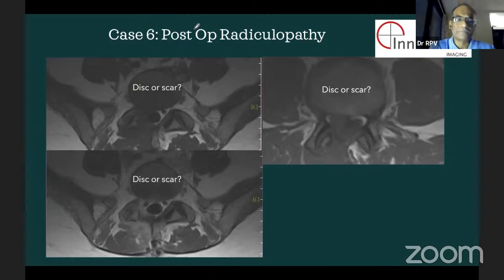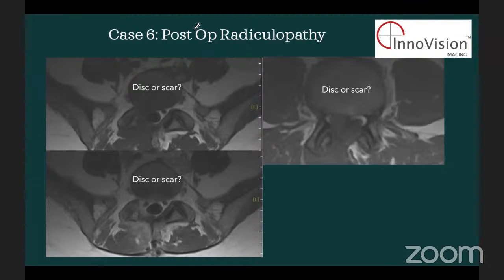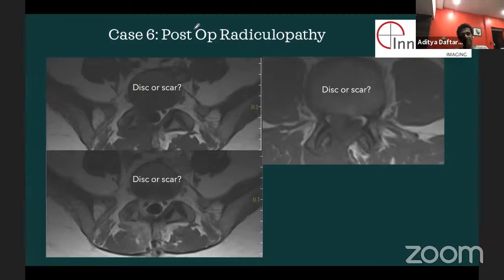Sorry. So what do you think this is? Sir, usually in a post-operative scar, there is non-contiguous involvement with the disc and there is a homogeneous enhancement. So what's your answer here? You're still sounding like a radiologist. Pratik, disc or scar?